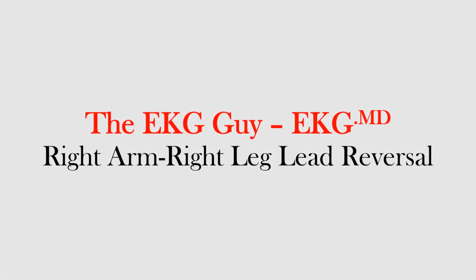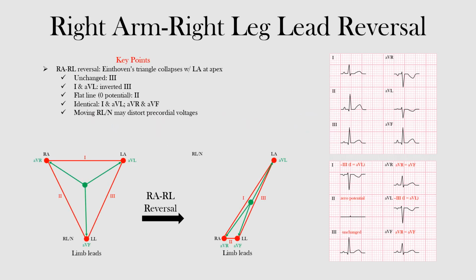In this lecture, we will discuss right arm, right leg lead reversal and how to identify it on the EKG. Making sure that the EKG leads are connected to the correct electrode position is important for getting accurate rhythm strips in 12-lead EKGs. If the leads are reversed, we call this lead reversal, and it can often produce EKG abnormalities.